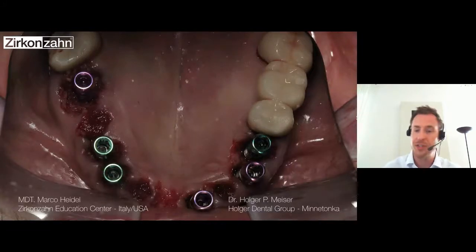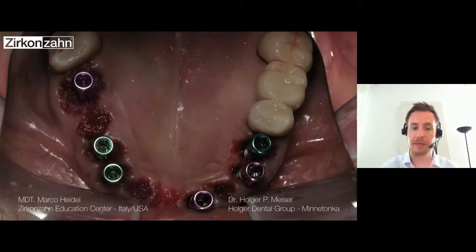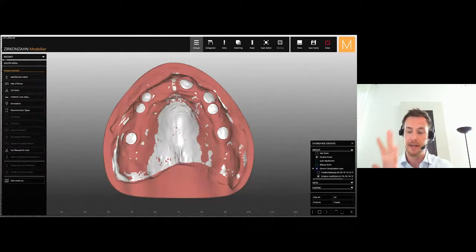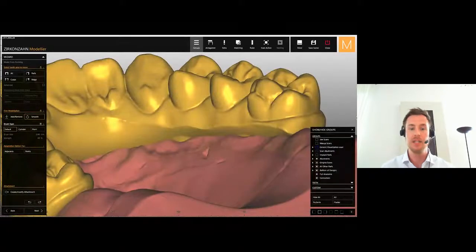Yeah, the impression copings by using physical impressions, or scan flags within a digital workflow. It does not matter. But in the end, via a matching protocol, I now bring the implant model to the previous pre-op model, match everything together, and what I do is just adapt the already made tooth setup onto the freshly placed implants. I have a perfect gingiva profile and so on.